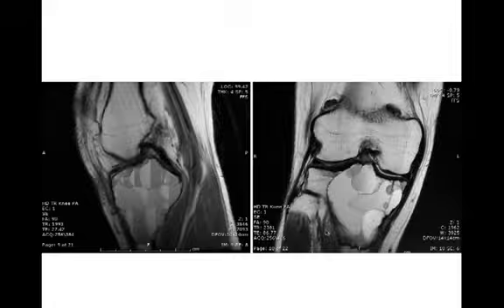This is an MR, which really just shows us where the lesion is located here in the epiphysis and the metaphysis. Even on the MR, you can see the narrow zone of transition right here of the proximal tibia, which is eccentrically located. So I can't tell you if it's lytic just by looking at the MR, but on the radiograph it was. So this was a geographic lesion, narrow zone of transition, eccentrically located in the proximal epiphysis metaphysis of the tibia. Also note the nice example of fluid levels we see on the sagittal view.